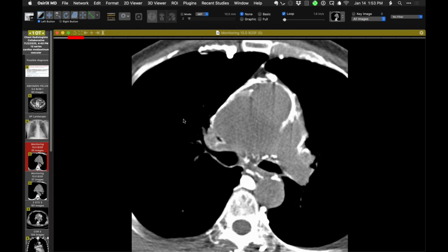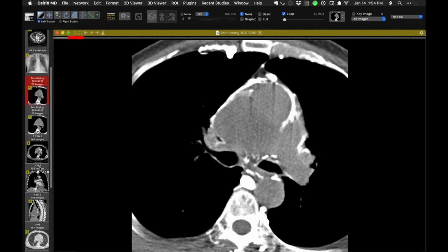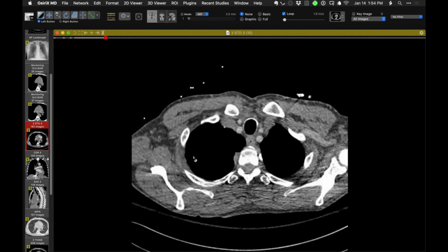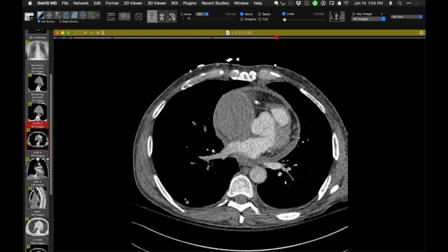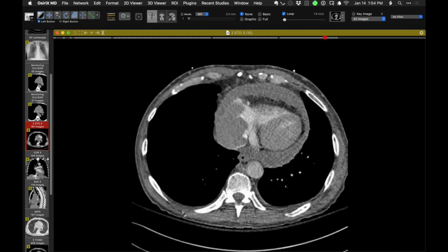Okay, I'll show this one. This is a patient that came in from the outside already with a diagnosis of something really bad. I'm not quite showing it in the right order, but when they ordered a CTPA, you could see that the person recognized that none of the contrast medium injected through an upper extremity vein made it into the right atrium.